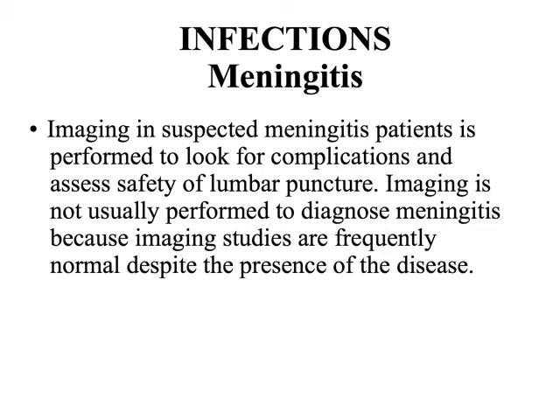Our imaging is not usually performed to diagnose meningitis, because the CT images are probably going to be normal despite the presence of the disease. Nevertheless, we may do a CT head prior to the lumbar puncture, just to make sure that there's not something else going on.